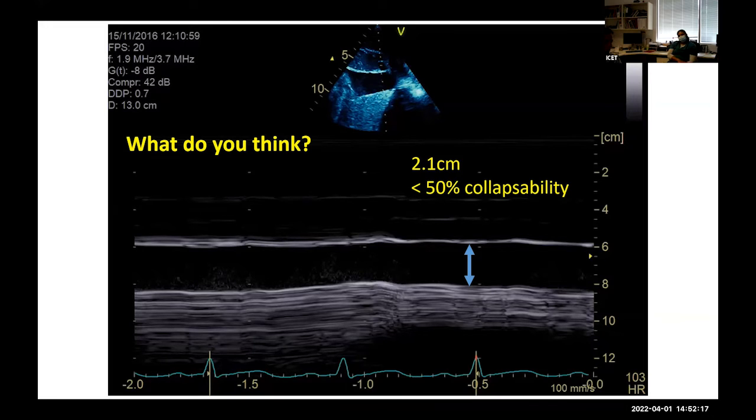I need to see what it's like in front of me to call it clinically, but more importantly, it's got to come out because it's got pus in the pericardial space. I wouldn't say for certain that I saw vegetation on any of his valves, so he'd need a transesophageal echo to exclude infective endocarditis, so that's quite likely. Okay, move on to the next slide.